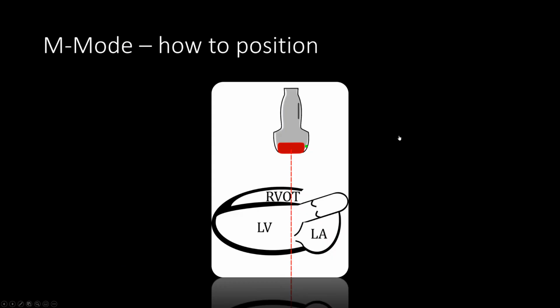As we discussed, M mode can be used for this application. I really want to stress that M mode is not essential for most applications of septal assessment. The subtle changes that it is most useful for are not for basic usage. They are mostly for assessments such as constriction and restriction. Most of the time, simple 2D structural changes in the parasternal short axis view are sufficient.